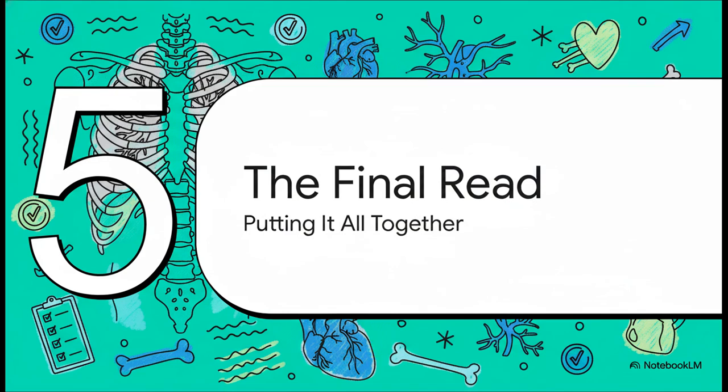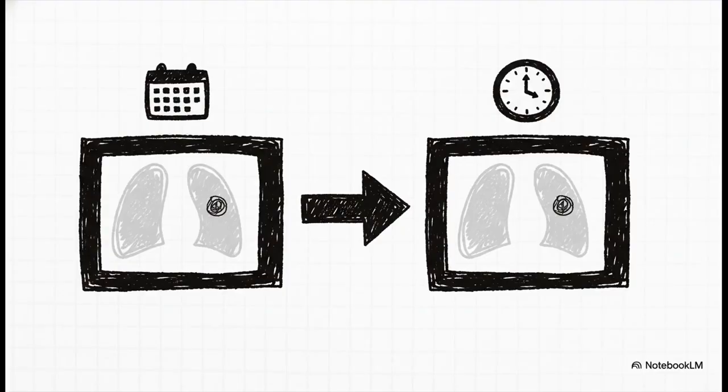Okay, we've covered the alphabet, we've gone over quality checks, and we've walked through the system. Now let's just bring it all together with two final principles that really take a good reading and make it a great one. And this right here might be the single most powerful habit of all. Anytime you see something that looks even a little bit weird, the very first question you should ask is, was it there before? Comparing the new X-ray to an old one is without a doubt the best way to know if something is new, if it's getting worse, or hey, maybe even if it's getting better.